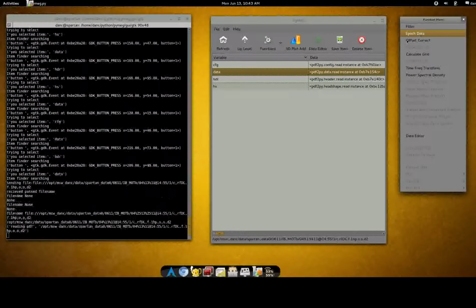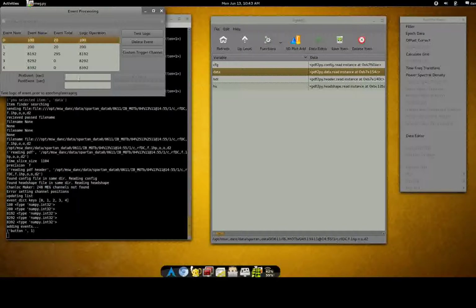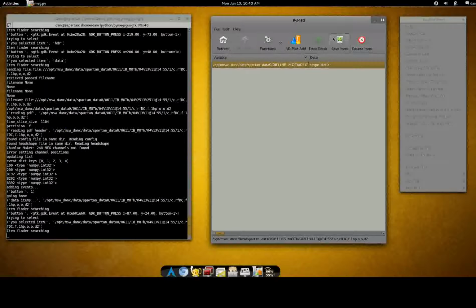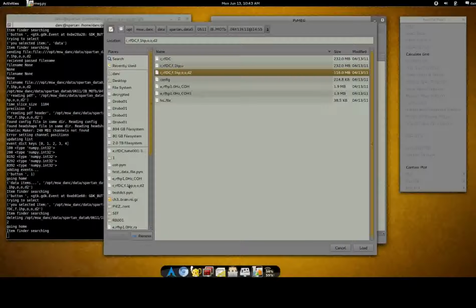Let's actually create an average of this long data set. This was an auditory evoked, actually this is a motor task. So we're going to see what kind of event-related potentials came from. Actually, no. I'm going to go to another file, an auditory evoked response data set.